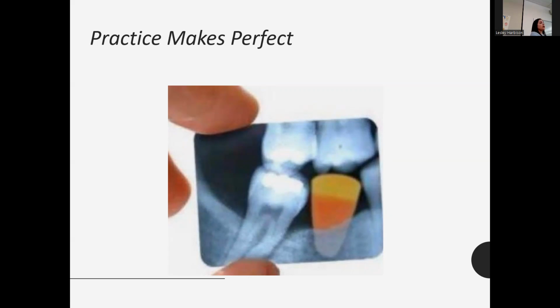So when you're ready to go up there and sign up for the dentist, make sure that you have done everything in your power to write down everything you see on the radiograph, plus what's inside their mouth, what restorations they have, and not just like a composite, but also surfaces. So it's a lot that the dentist expects out of you to get all of that stuff in there. And so you want to be able to put that stuff into practice. Okay, so I'm going to stop this one and then I'm going to pull up the Perio.